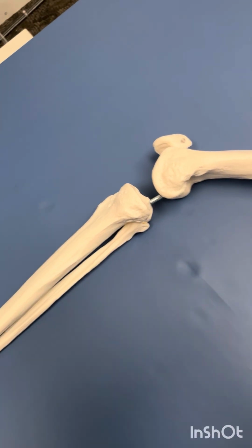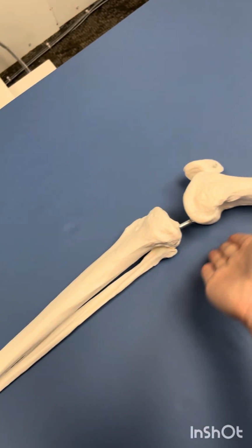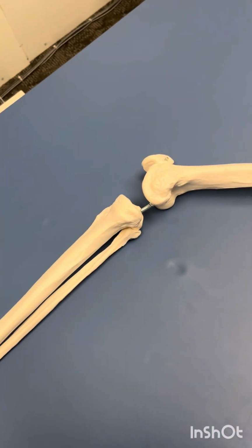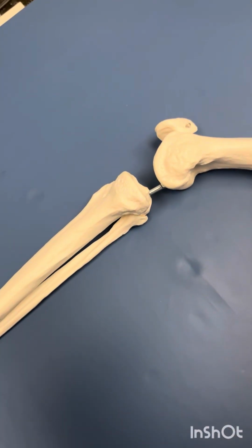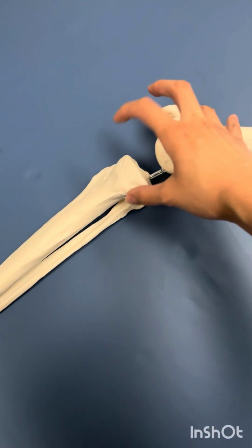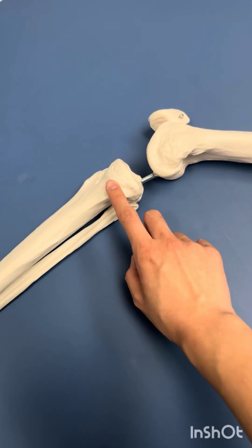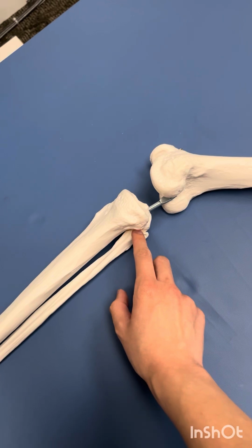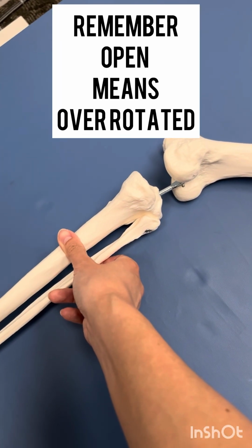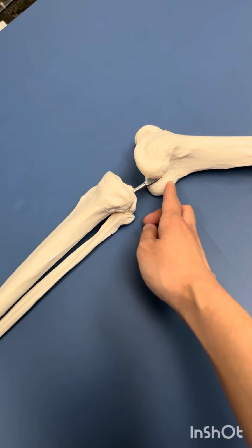Once you have taken your lateral x-ray, what I always do is look at the posterior aspect of the knee and see what is too posterior. So if it's perfect, the medial and the lateral condyles will be lined up perfectly, and then there will be a little bit of an overlap between the fibula and the tibia. If it's over-rotated, the joint space between the fibula and the tibia will be open more than it should be, and the lateral condyle will be posterior.